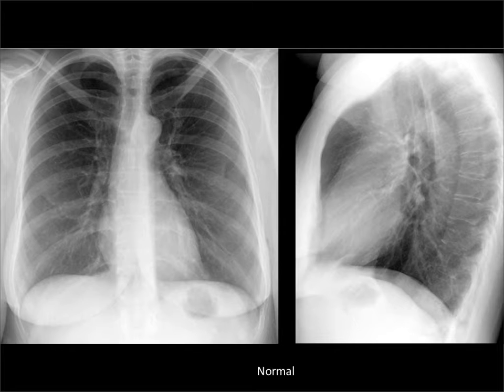Let's move to the left ventricle. So the left ventricle forms the majority of the left heart border on the frontal, and it forms the inferior and posterior heart border on the lateral chest X-ray. Now, the left ventricle in normal patients shouldn't come back more than about, here's the inferior vena cava, this little curvy linear thing here. Shouldn't come back more than 2 or 3 centimeters posterior to the inferior vena cava. And as it enlarges, it goes down and posteriorly like this.